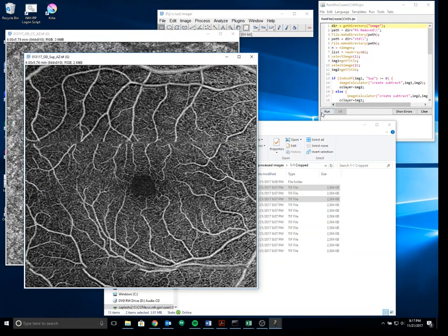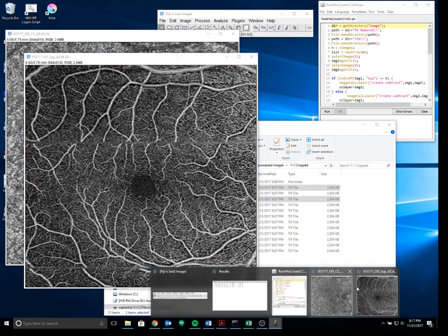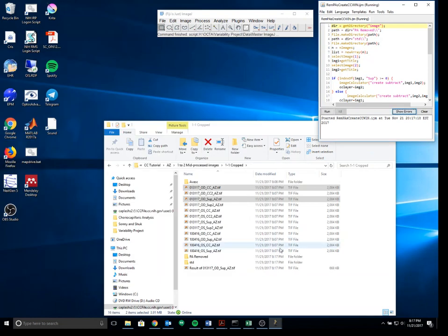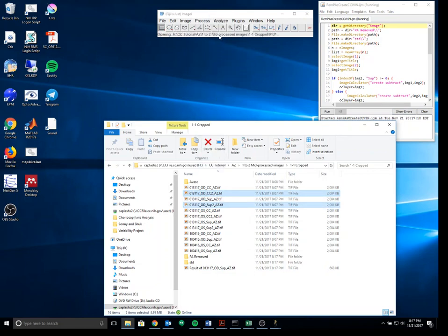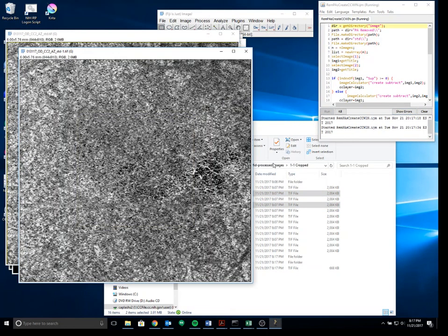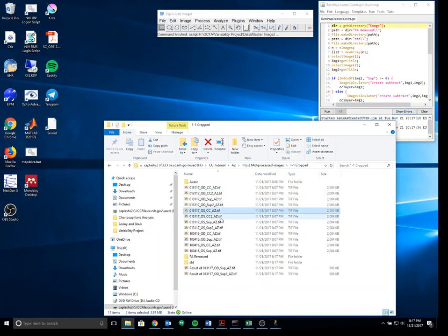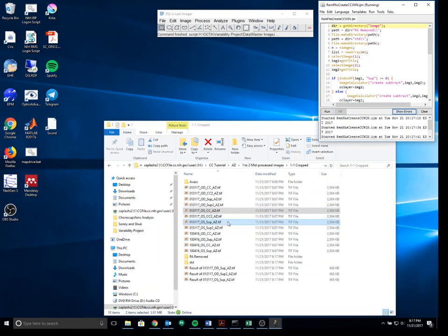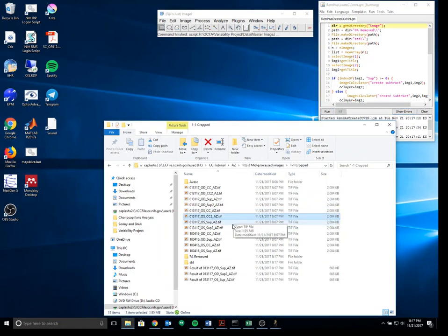And the way this algorithm works is I'm simply going to hit run. Well, you want to ensure that there are no other images open, because it'll mess up the algorithm. So you have these 2 open, and then you're going to hit run. And then you'll see it binarized and standardized them. And you'll see that this algorithm automatically spits them all out right here. So, for the sake of time, I'm just going to quickly run through the rest. You will see that as I keep doing them, it will keep spitting them out down below.